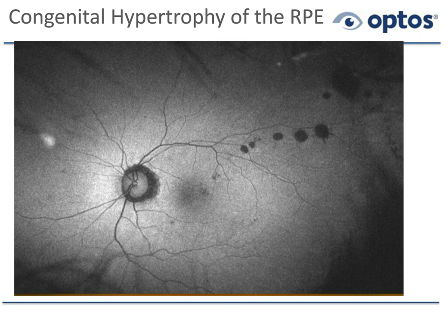So again, in this instance, it's an exception. It doesn't mean we have dead RPE. It really means we assume that the photoreceptors are not over the lesion when we do OCTs through these lesions. The photoreceptors are not present, hence lipofuscin is not being produced, and there's no lipofuscin to be absorbed by the retinal pigment epithelium. So the lesions look dark. So this is something that's important to know.